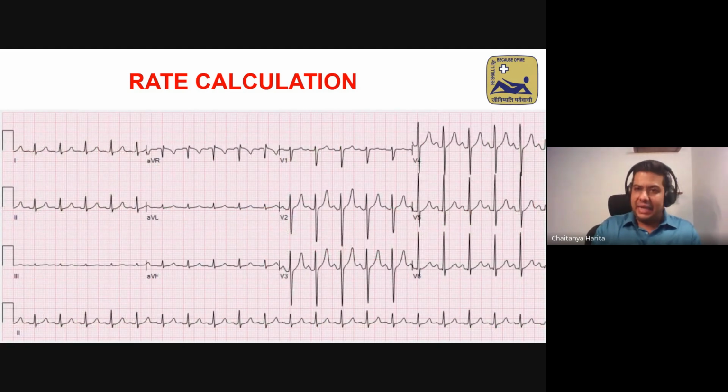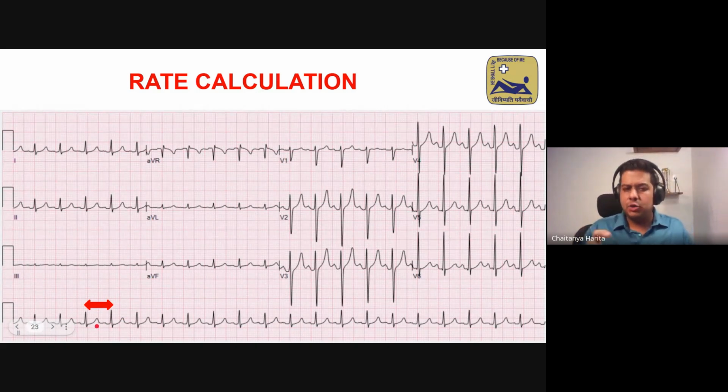Right? This is the formula that we apply. Look at this. This is a patient with tachycardia. The heart rate appears high. First, we'll always look at the calibration. One wide, two tall, perfect. Take lead 2, right? Calculate the number. So there are approximately maybe two, a little more than two big boxes. So 300 divided by about two, the heart rate is in excess of 120, it's about 150, which means this is tachycardia. So this is how you calculate heart rate.